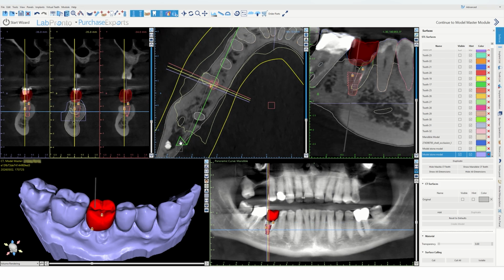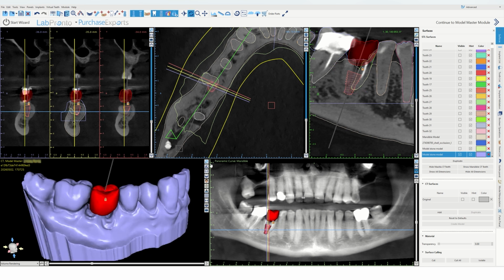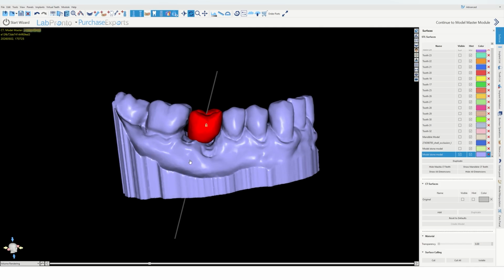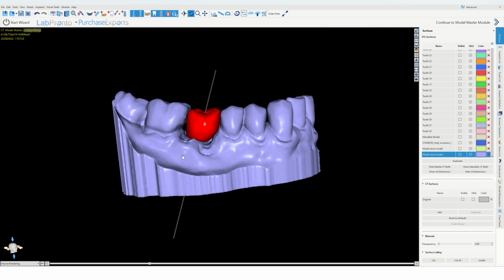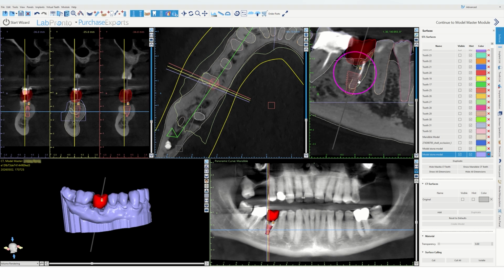Let's see what we can do. What if I tilt this way? Yeah, you could, but that's very tilted. Look at how tilted that is. That's a weird angle. Yeah, there's a distal root tilt on teeth, but not to that extent. That's excessive. Okay, so let's get rid of some of that angulation and drag this forward.